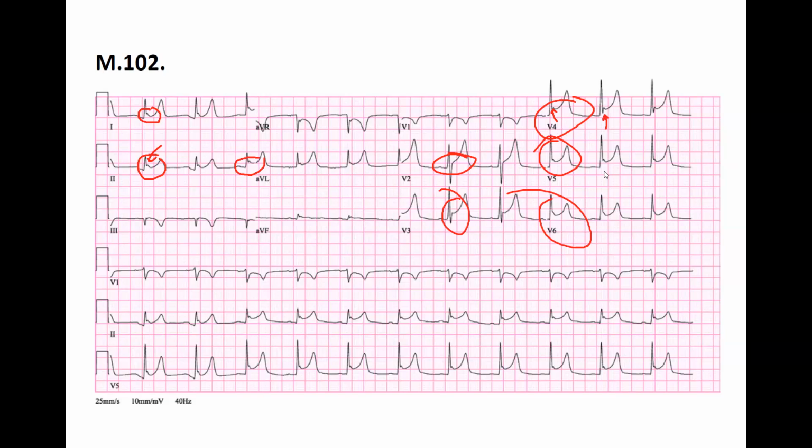Tricky ECG. First, if you see some kind of ST elevation, you go for the MI, ST elevated myocardial infarction. And you know nothing about the anamnesis of the patient. It has some chest pain, and of course, it's not radiating anywhere. But because you see these kinds of alterations, a lot of ST elevation in different leads, involving the inferior and anterolateral areas, relatively a huge ST elevation, you assume that it can be the sign of pericarditis. This is not so common, but you can have pericarditis.